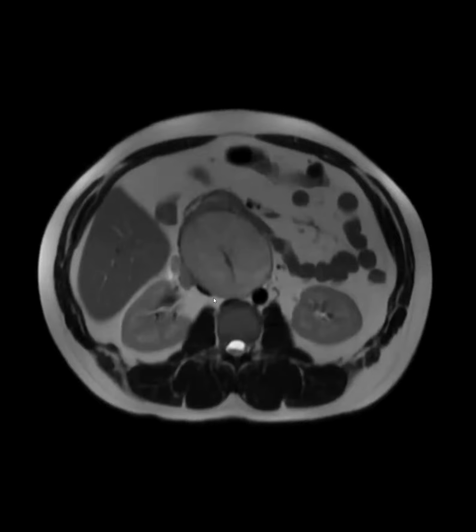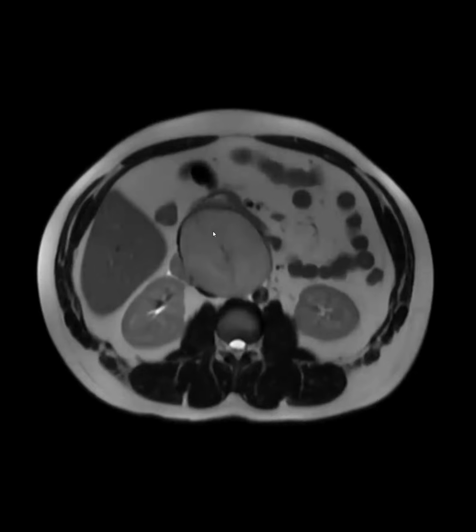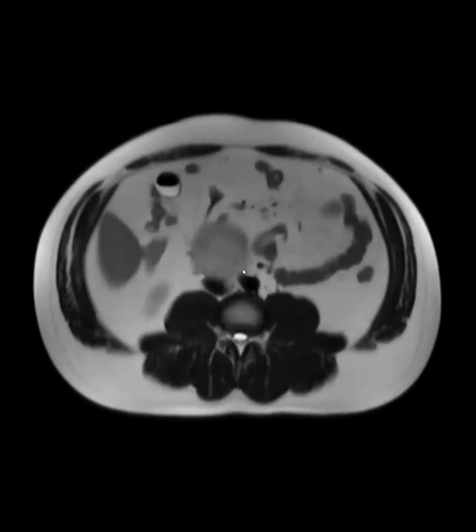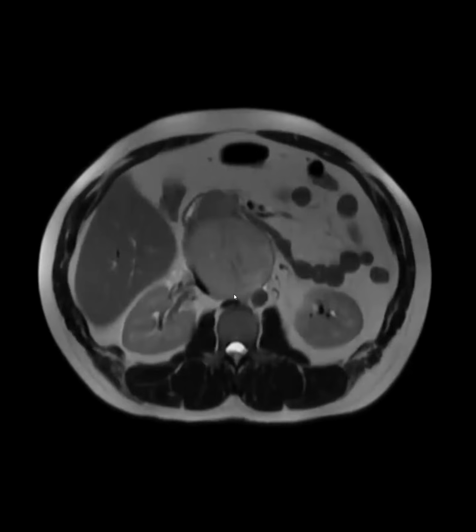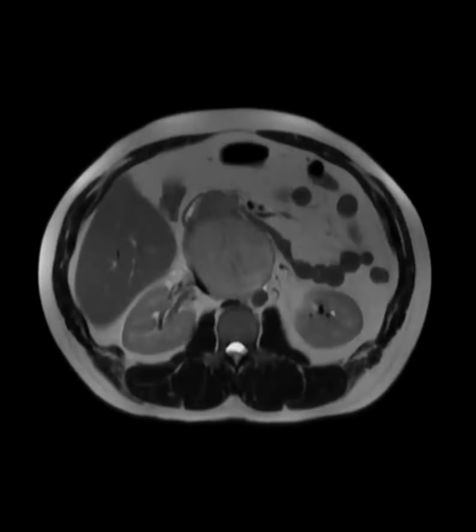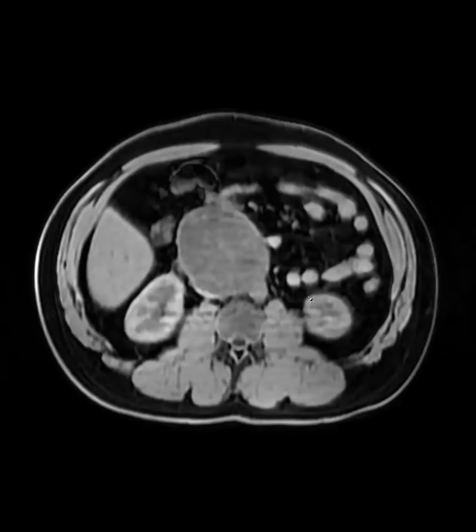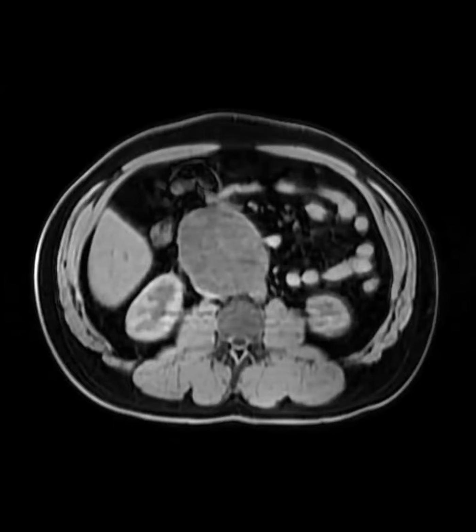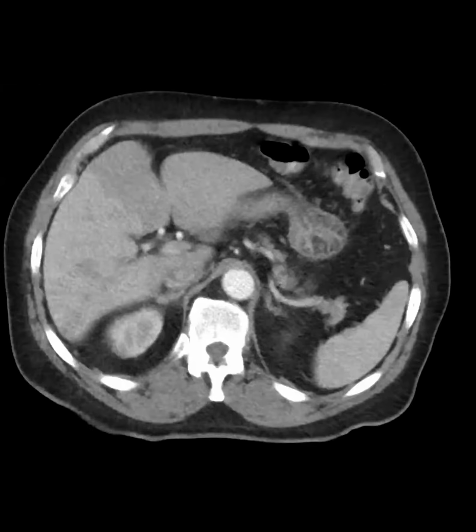And honestly, this part may just be a hematoma. Maybe these metastatic nodes eroded some blood vessel and caused a big hematoma here because it's so non-enhancing. But the T1 was not right, was it? No, it was not. Maybe it's an old hematoma. Yep, there's a little bit of peripheral T1, a very thin rind.